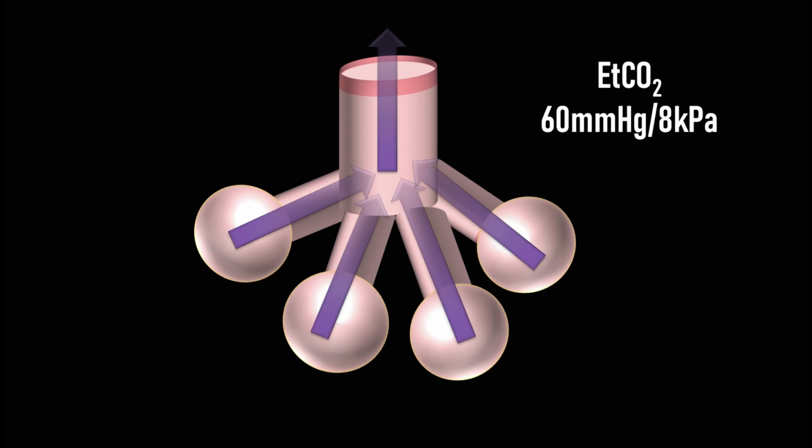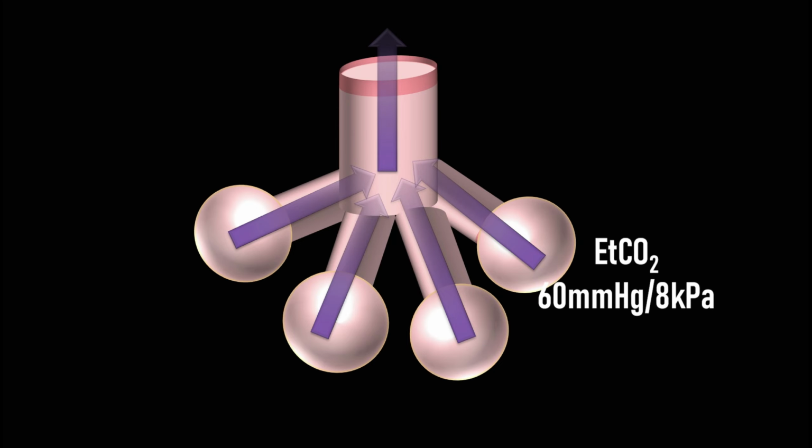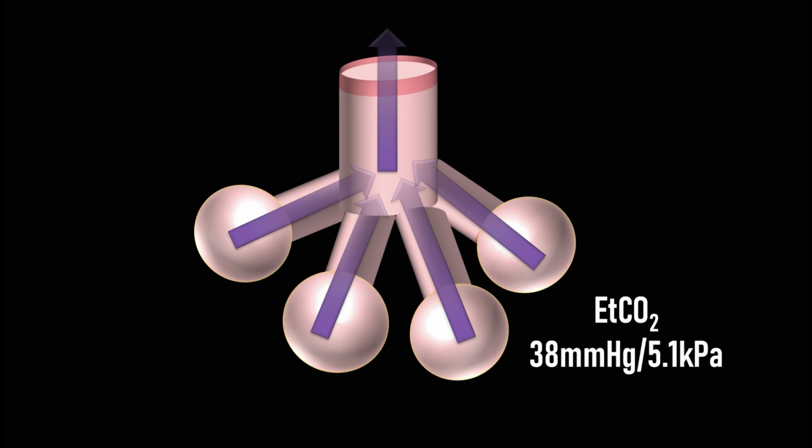The initial CO2 is quite high, but resist the urge to increase ventilation too much, as over a few minutes, the end tidal CO2 will normalize. All of this can be prevented by performing a recruitment maneuver.